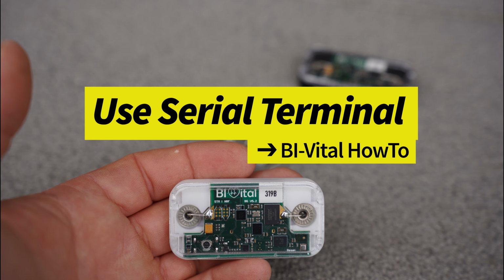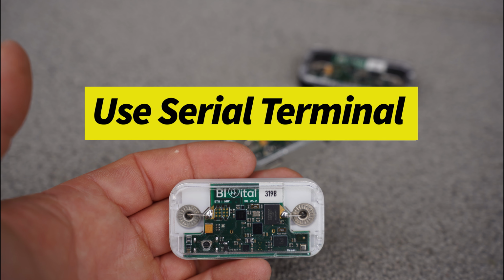In this video we demonstrate how to communicate with the BVital sensor through a serial terminal. The Python BVital library should already be installed beforehand. If you have not done this yet, please install it now. A separate video tutorial explaining the installation is already available.